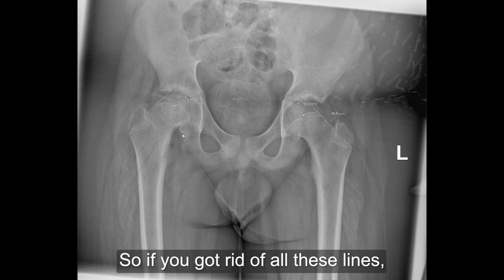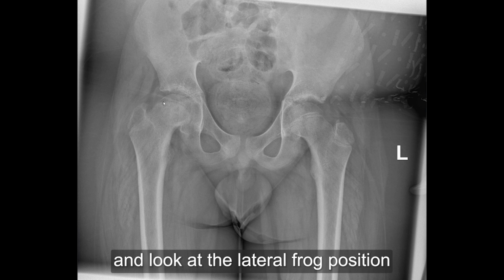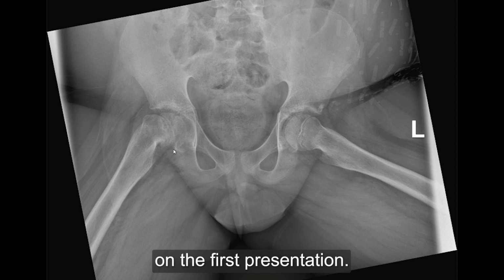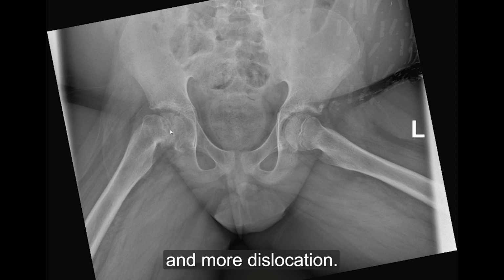So if you got rid of all these lines, as we were doing there, and look at the lateral frog position, which was obtained this time, I'm sure you will never miss this. Now it's been missed on the first presentation, and now it's come with more displacement and more dislocation, and this needs to be sent to the orthopedic team to consider treatment.